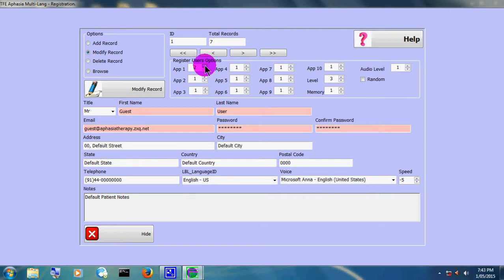You change it to number 2, then number 11 to 20 would be visible. Change it to 3, number 21 to 30, etc. And as 100 records have been uploaded, you can go up to 9, 10. At setting of 10, it will be record number 91 to 100, which will be visible. If you do go above that, it does allow at the moment. I made it flexible because in case we do upload more records in the future.